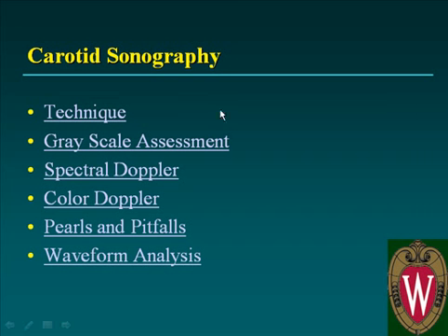In this lecture, I'll talk first about the technique of carotid sonography, something about the grayscale assessment of plaque and the vessel wall, spectral Doppler analysis, color Doppler, and end with some pearls and pitfalls.